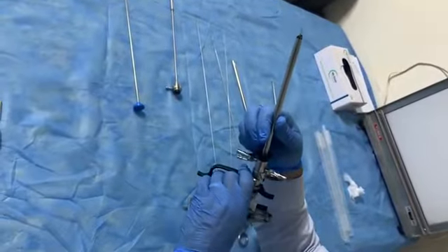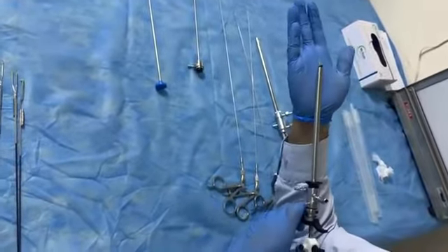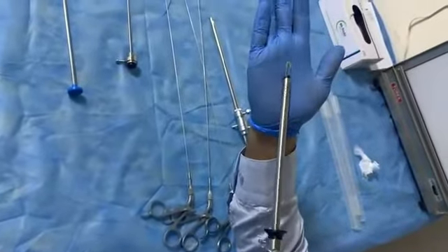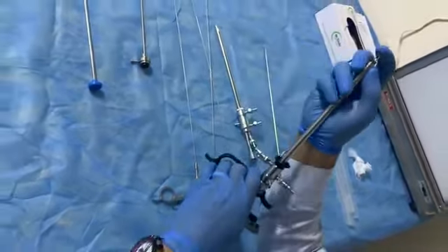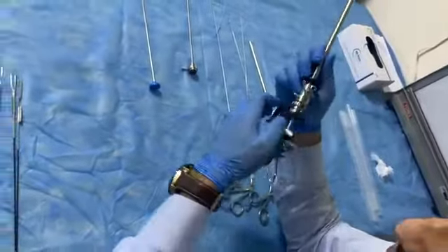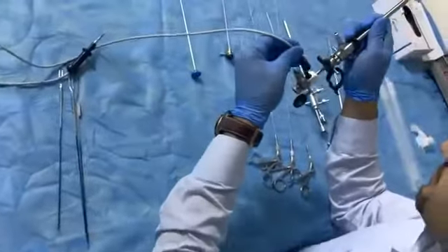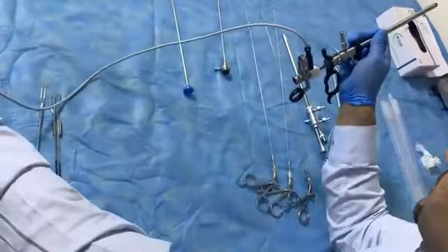This is called active, not passive. If you want to do some work, just press on it and cut the tissue. Suppose this is the tissue. And you connect the electrode. How do we connect the electrode? The current comes from here, and this connects for the monopolar system.